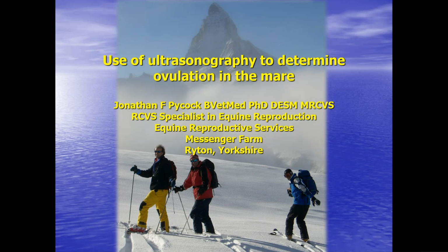And there's no doubt that ultrasonography has proven a really useful tool in helping us do this. Over the next half hour, 40 minutes, I want to present some of the information I've learned over the years using ultrasound, to give you some little tips and tricks to effectively use ultrasonography to determine ovulation.